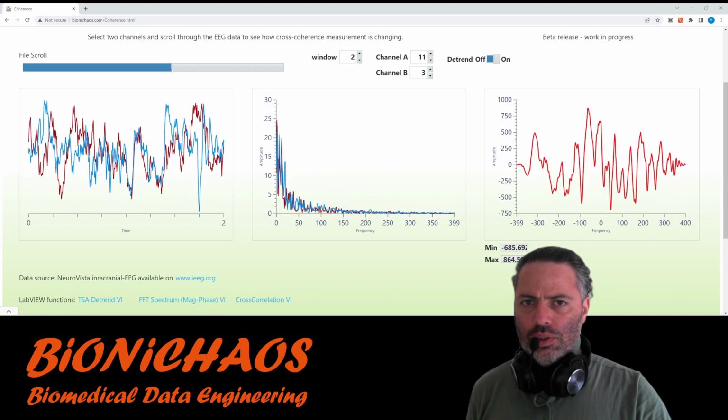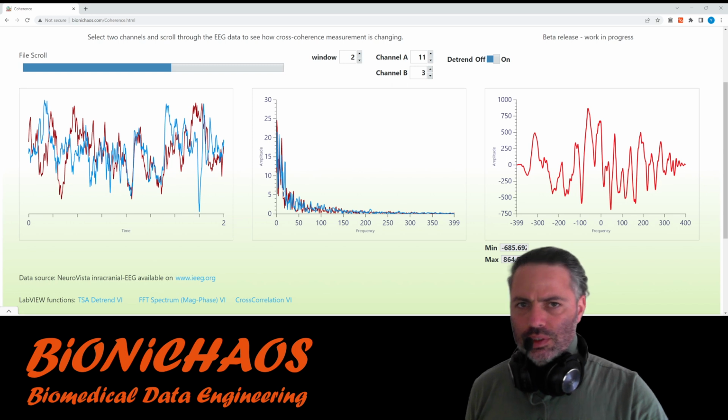And you can also see what difference it makes between the different channels. So some will be more correlated to one another than others.